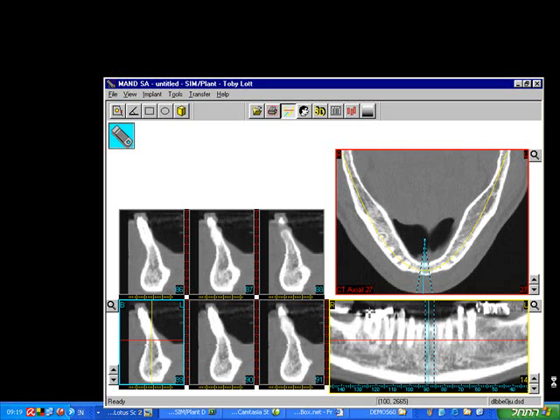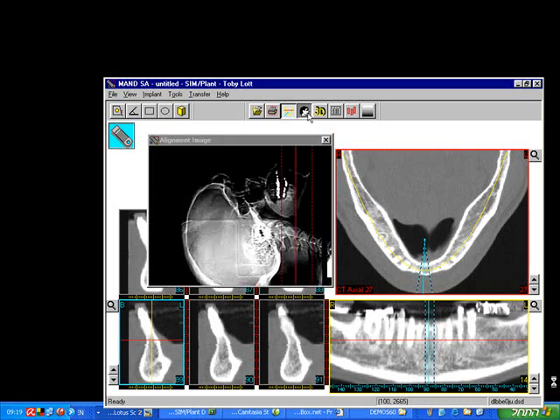Let's click on the head on the toolbar, which shows the alignment image. This scout view is the view that the CT technologist uses to properly align your patient in the gantry of the CT scanner. The proper alignment for dental CT is parallel to the occlusal surface of either your patient's mandible or maxilla. In a fully edentulous or mostly edentulous case, it is necessary for your technologist to reference a radio-opaque template made by the dentist indicating the proposed occlusion.